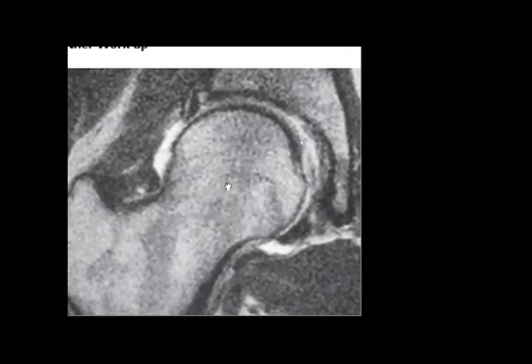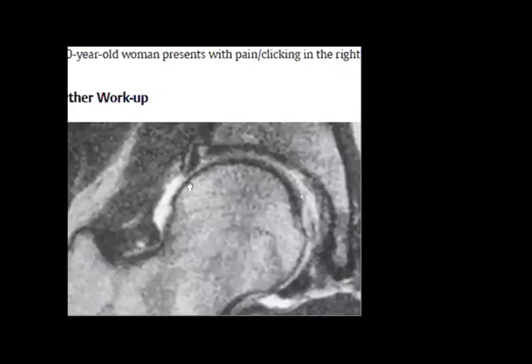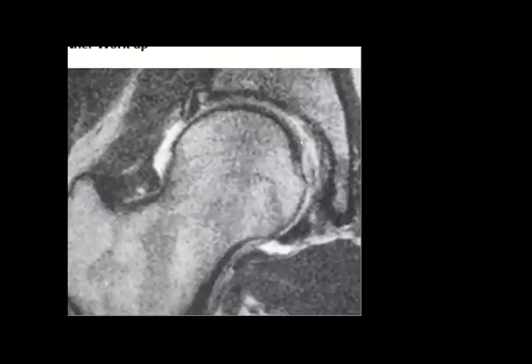So when you find deficient acetabular coverage of the femoral head, they like to draw on the X-ray an angle from the center of the femur, we call the center to edge. And if it is less than 25 degrees, this is called developmental dysplasia of the hip. You remember our case in the last session, it was again about this.